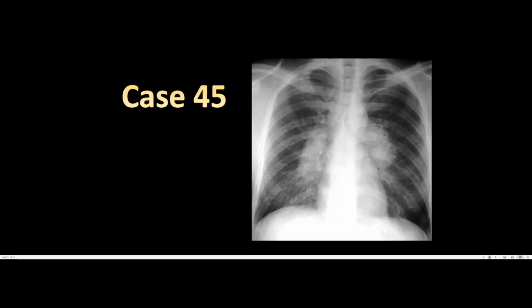Again, this is the same finding that we've seen before. This is a clear-cut case of pulmonary hypertension. You can see how they're enlarged. They're not lobulated in appearance. All right? Again, you need the patient's history to correlate with the chest imaging.